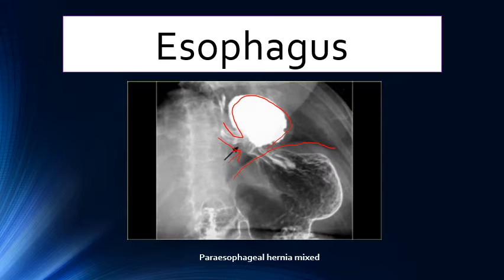And we have the severe form, which is a gastric herniation from the hiatus.